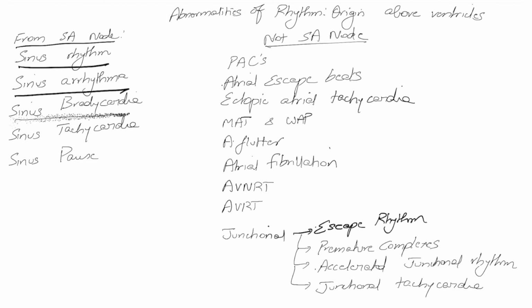In sinus bradycardia, the heart rate is lower, but otherwise, again, the axis of the P wave is normal. P waves look pretty similar. Every P wave is followed by a QRS complex, and the PR interval is okay.